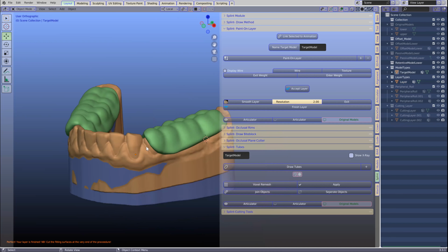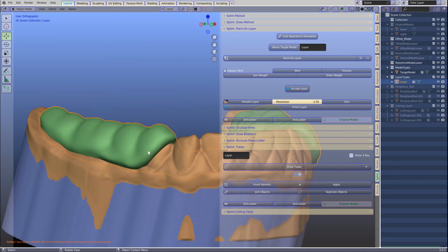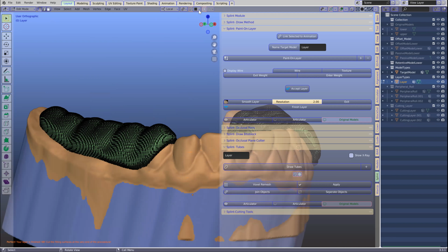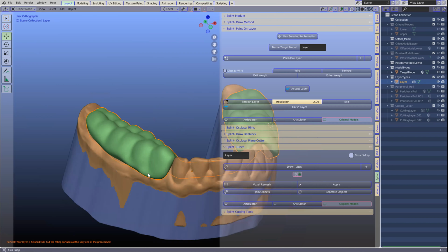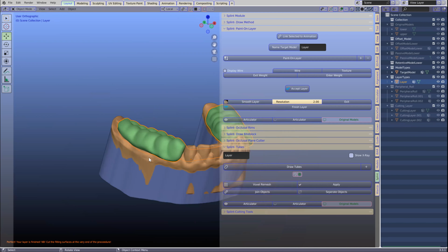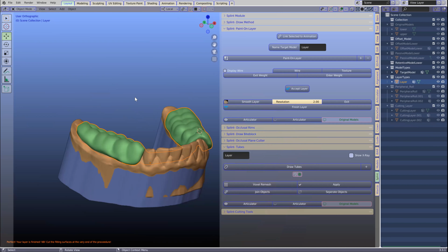You may think, oh, well, maybe I should take it further down here. Okay. So what you're going to do is go tab, edit mode. Okay. Make sure your proportional editing tool is on, magnet tool is off, and then you can always grab your mesh structure if you want it. Okay, so that's just one way of doing it. And so the proportional editing is very important because you can do a lot of things with it.